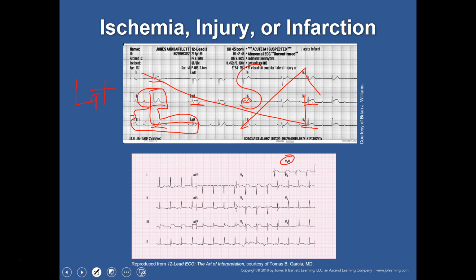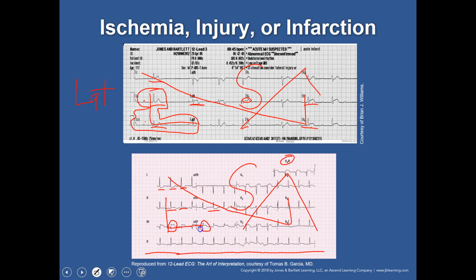So once again, all of lead 2 under here. So 1, we've got this and this, this and this. Now let's take a look. Starting with our lateral. That looks fine. Looks like actually a little bit of depression, right? You agree? Yeah, looks like some depression. And these all look okay. 2 and 3. So we see elevation, a lot of elevation. That's screaming, I'm sick. A lot of elevation.